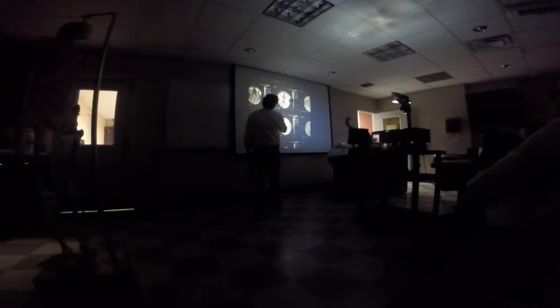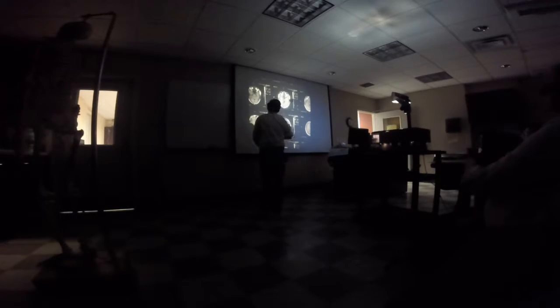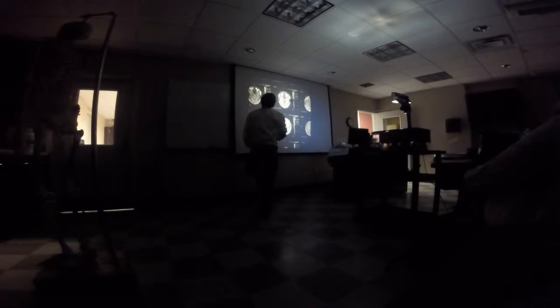What is this structure here? With the cerebral peduncles? That's the midbrain. It's hard to tell here, but there's the cerebral aqueduct right there, that little dark area in the center.